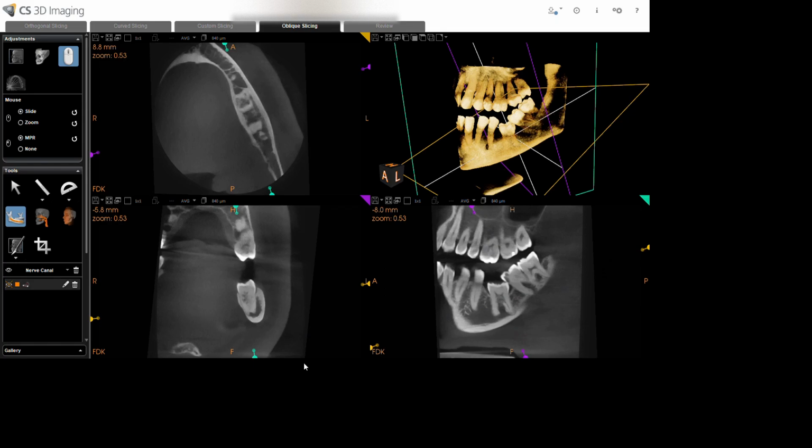So in brief, what is happening in this case is that the entry point is lingual, the resorption is extending into the radicular dentine and the coronal dentine, both on the lingual and buccal aspect of the pulp chamber, and thereby involving nearly the coronal thirds of the roots. Now since this resorption is subcrestal, the chances are very less that this tooth is restorable. It definitely has a poor and questionable prognosis.